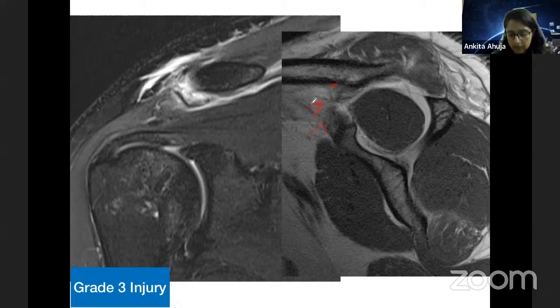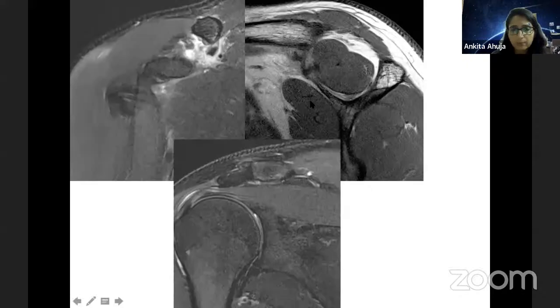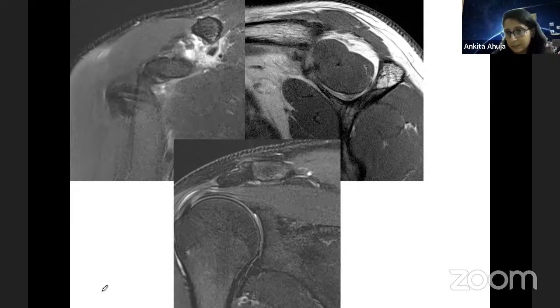So MRI really helps you to figure out and put injuries into a proper bucket. Now, actually, this case is open for you all to see and appreciate what you think about it. And it has an important message also to pass on. But I'll just go through the case.